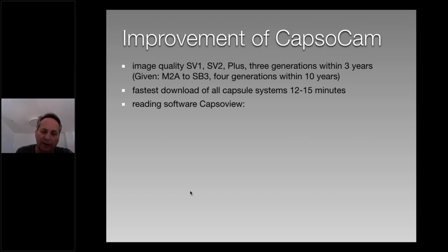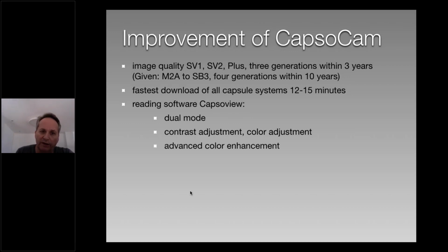We have the reading software, the CapsoView. You will see it in 1 minute. The dual mode I told you. You can adjust the contrast and the color. We have an advanced color enhancement system. You can open multiple windows, even while you're downloading a case.